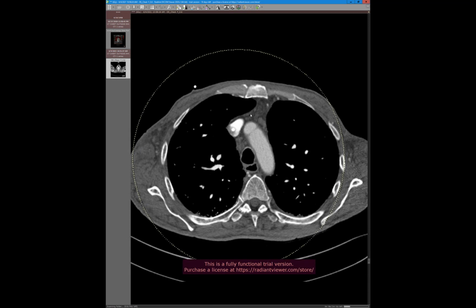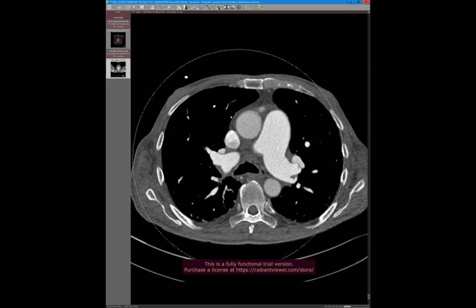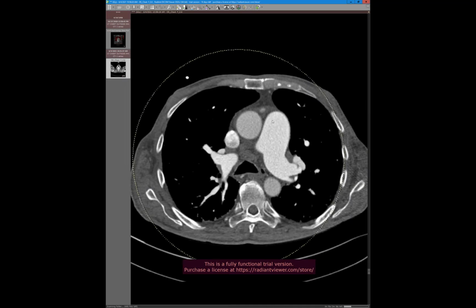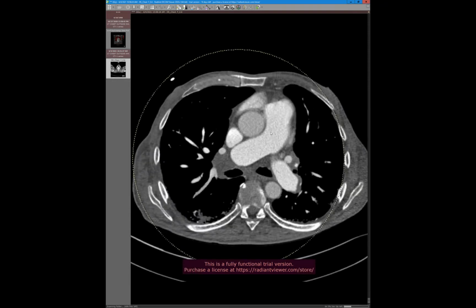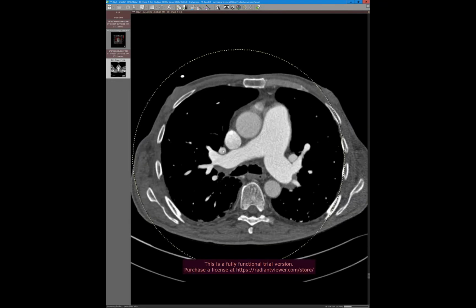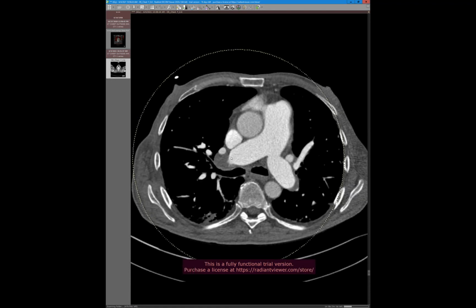And this becomes the distinction, and not always easy, between in situ thrombus versus embolized material or embolized thrombus. And you know, it's something that we see sent to us quite frequently. Now, this patient does have a few areas where, you know, you can see, sorry, this thing is just taking its time. There's really no obstructions at any level.